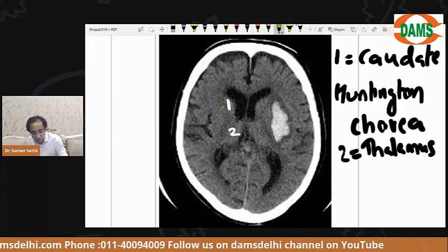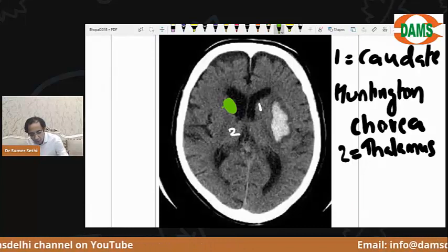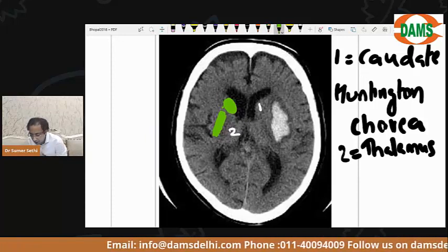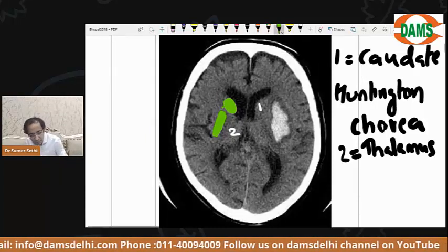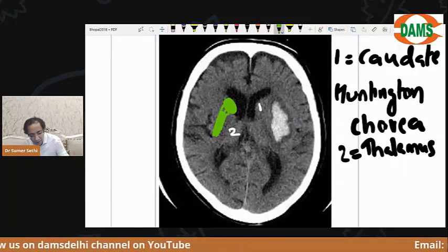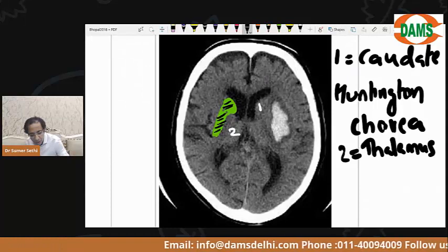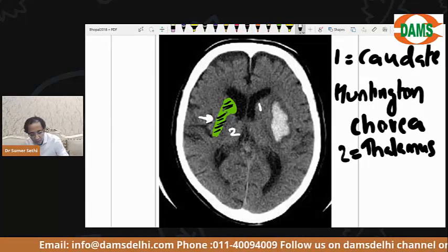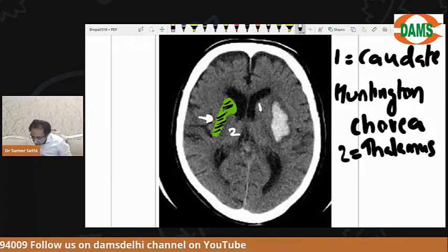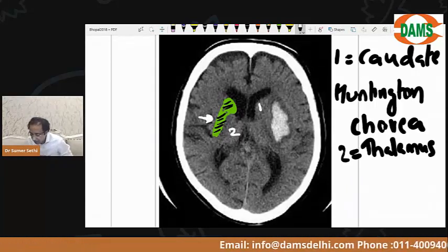Okay, so if this was the area of the caudate nucleus, I only want you to tell me, कोई भी बच्चा मुझे बताए, behind the caudate, we have a similar looking area just behind the caudate with some striations inside. थोड़ा सा ऐसे line होता है ऐसा, connections हैं, lines हैं. कौन है ये? What is this area? Anyone can tell me. What is the area behind the caudate nucleus? Okay, head, बेटा हुबनर्स आर्टरी हेड को करेगी ना, टेल तो बेटा बहुत दूर है, है ना? क्लियर कि नहीं?